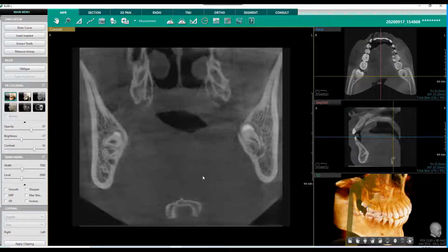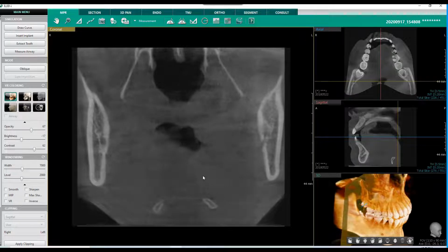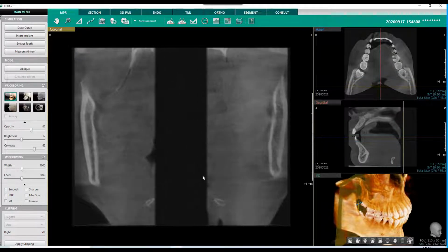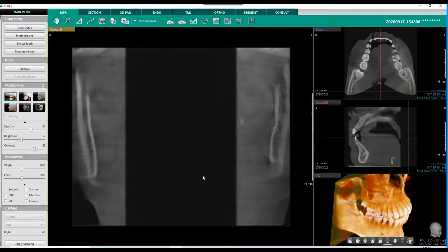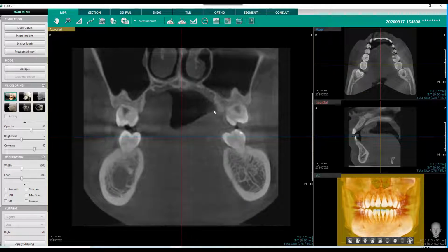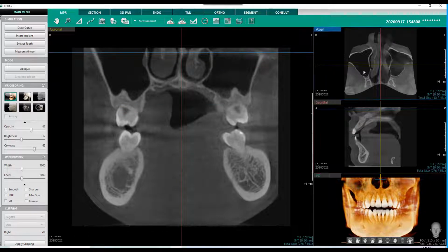We're now looking at our hyoid bone and scrolling back through posterior and almost all the way back through the scan itself. So this practice took us on this demonstration about 7 minutes with me going through and explaining everything. I believe that this can be done once we understand the software and once we understand the anatomy in a few minutes here.